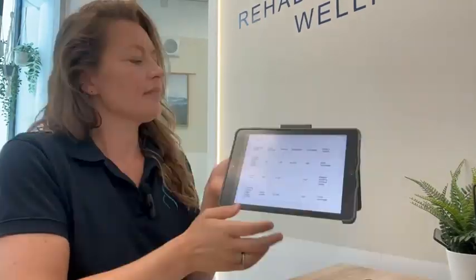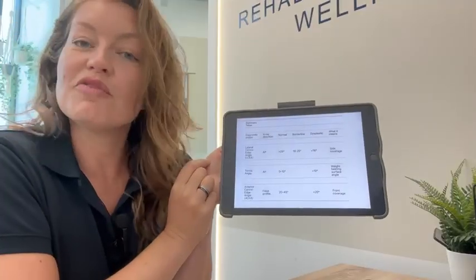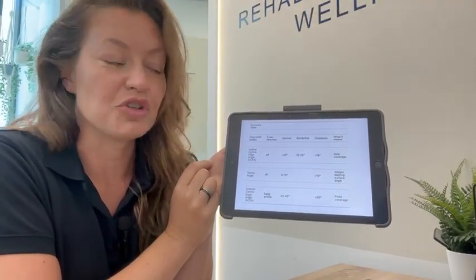So with dysplasia, if you don't have very much coverage, it's going to give a lot more instability in the joint. The more coverage you have, the more stability you have in the joint. And there's a level of that coverage that is an optimal level. So with the dysplasia diagnostics, we have in our table here the lateral center edge angle. If it's over 25 degrees, that's pretty good coverage and you're going to have a nice stable joint.